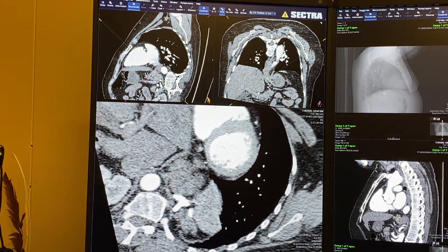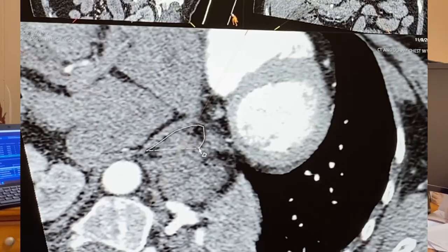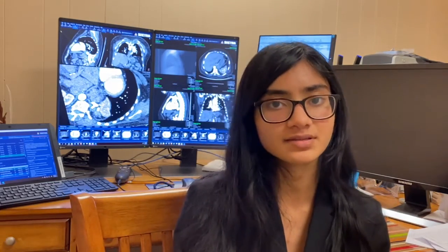After some manipulation, the transverse plane will look like this. And this is a pretty good example of a hiatus. The teardrop shape is very defined. And using the measuring tool in the program, I was able to find the surface area of this structure. I repeated this process 119 times with 61 males and 58 females in age groups 20 to 40, 40 to 60, and 60 and above.